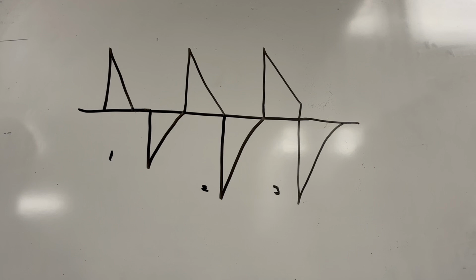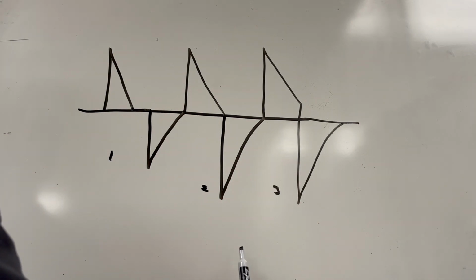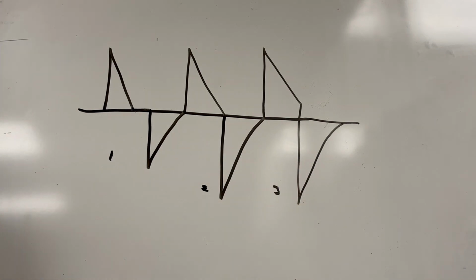And if their compliance is better and you look like this, then you go back to, okay, what's our I to E ratio? Can we stretch out our I-time? We need to talk to the doctor. What do we need to do? Do we need to make some changes?